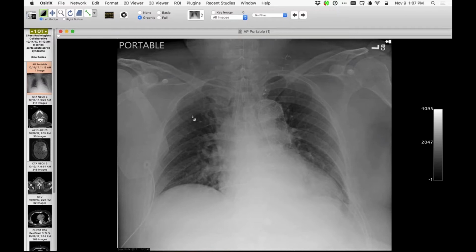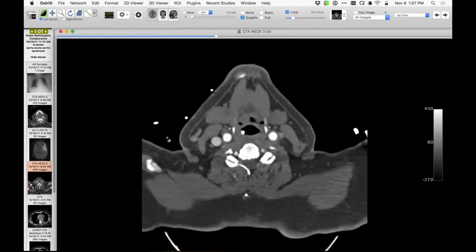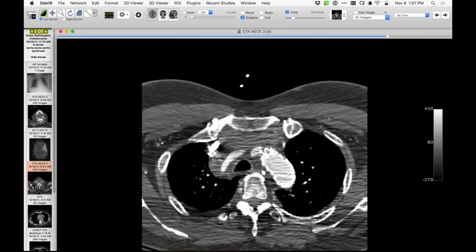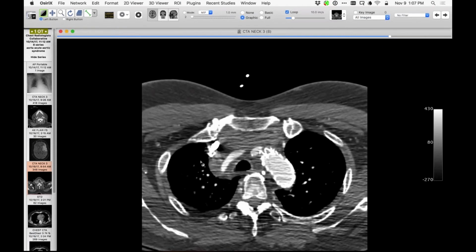So that's some background. When he came in, he had a stroke, and as is fairly typical, they do both brain and also carotids. So here, one of my colleagues in neuro came in and said, hey, there's something really odd here about the aorta, or I should say the innominate artery particularly.